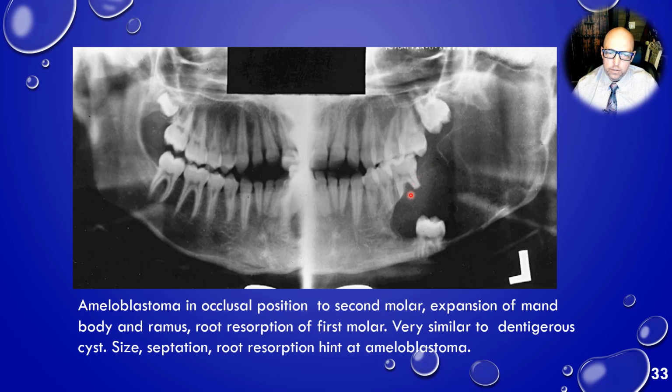You see some resorption, very benign pattern of root resorption here. Well-defined, corticated borders, but more expansile. I would say if you compare to those OKCs, this looks a bit more expansile. Could this one be a dentigerous cyst? Sure. Looks like it attaches at the CEJ of this impacted tooth. Or this could just be an Ameloblastoma, an OKC, that has displaced this tooth inferiorly. And in this case, with the expansion pattern of it, maybe Ameloblastoma fits before those other two.